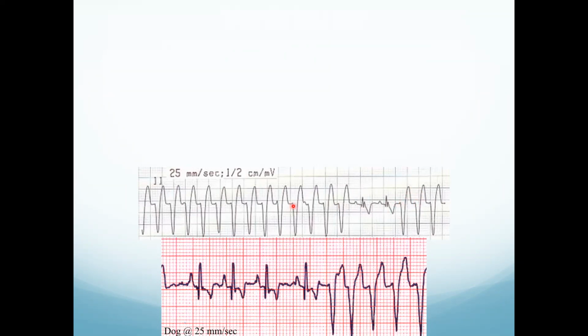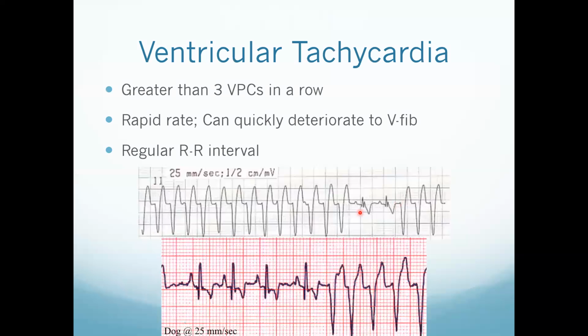And how we know it's ventricular tachycardia and not a supraventricular tachycardia with a bundle branch block is that we don't have associated P waves. I don't see, there was no P wave that initiated this first beat here. Okay, we've got PQRST, no P wave in here before this run started. Same here, no P wave started this run. So we don't have any association with the P waves, so we must be dealing with ventricular beats. So this is ventricular tachycardia.